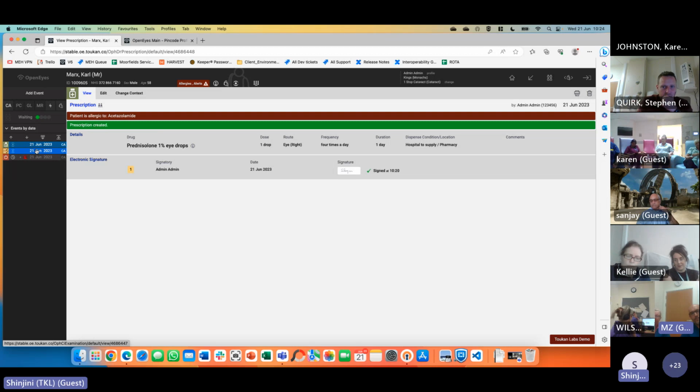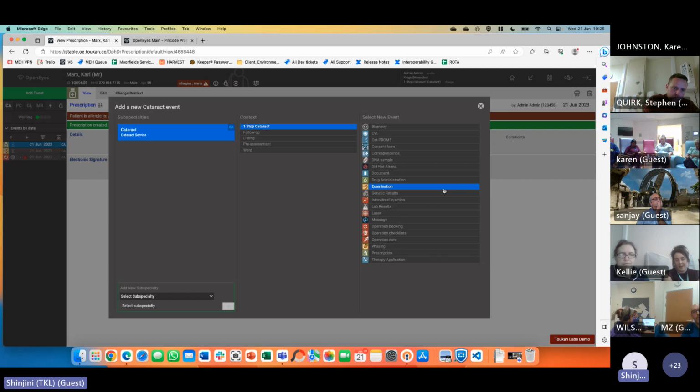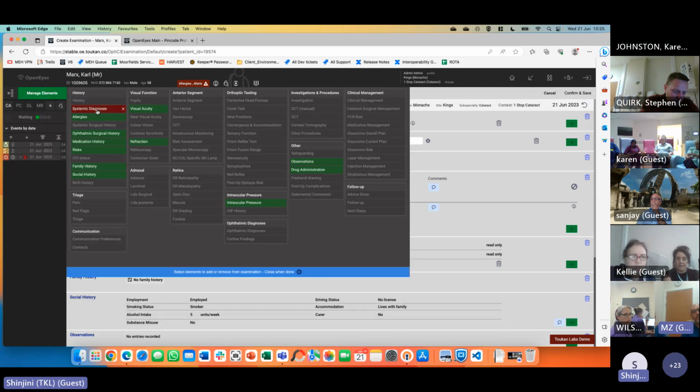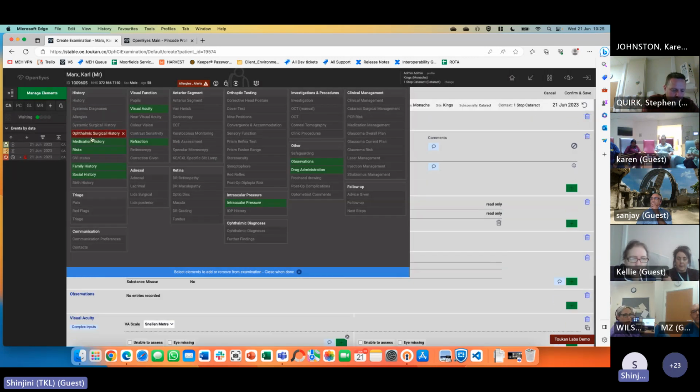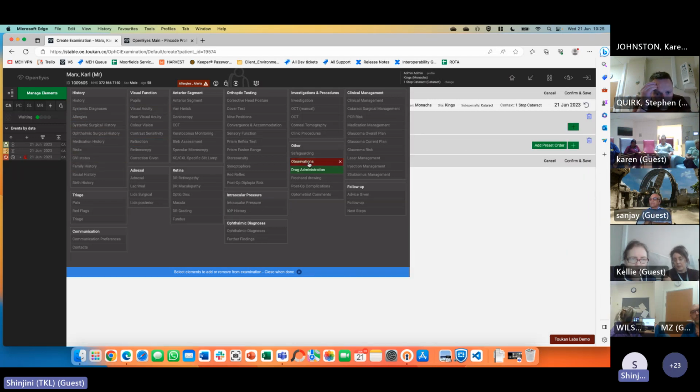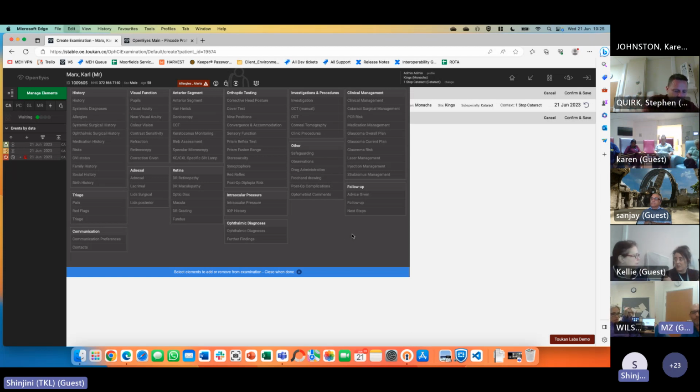Yes, all data is auditable, and whatever you input is recorded in the database with the proper audit trail. So yes, it is all auditable. And with respect to your other question about the drawings, I'm going to show you an element, because there are so many elements that we just took a section of it. I'll remove the other things, and there's something called a freehand draw.